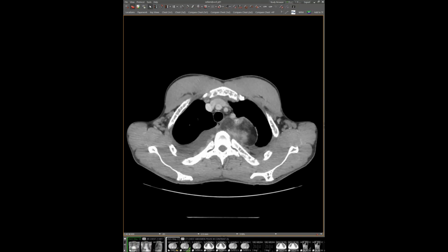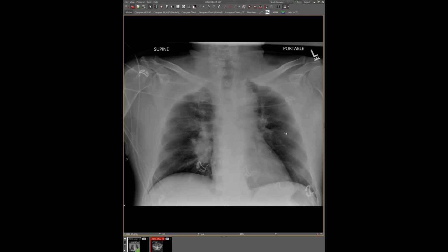Cool. All right, and then this was my other case. So this patient came in acutely with pain, though interestingly abdominal pain. And this was a chest radiograph that they had. We can see that there's obviously some opacity involving the right hilum. It looks pretty localized to the hilum itself. I don't know, maybe the contour of the aorta is a little weird. It's kind of hard to tell. The patient's a little rotated.